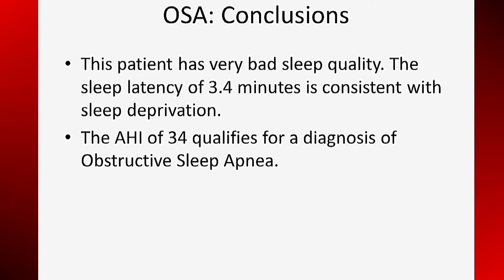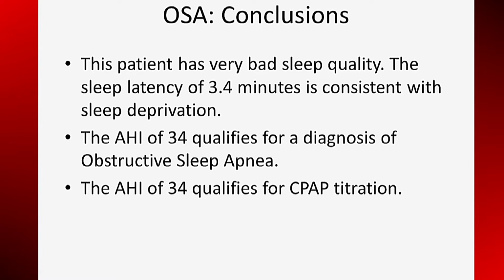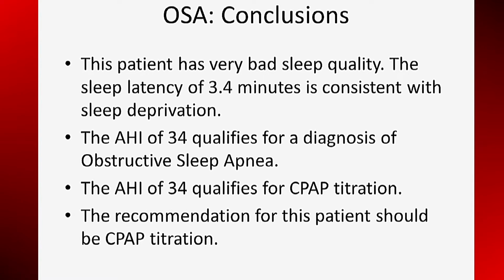The AHI is very high at 34. This meets the criteria for a diagnosis of obstructive sleep apnea. The AHI of 34 also meets Medicare guidelines for CPAP titration and therapy. This patient should have a CPAP titration.